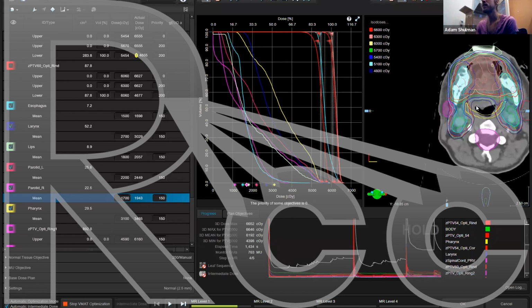But there are times, like in the large pelvic mass case that I'll do a planning demonstration with. There, it's much wider than 15 cm. And so I actually offset to one side with my collimator angle and then offset to the other side so that I could have multiple arcs covering it. And at the end, I can just pull that one up for you and show you, but there are just a lot of different variations.